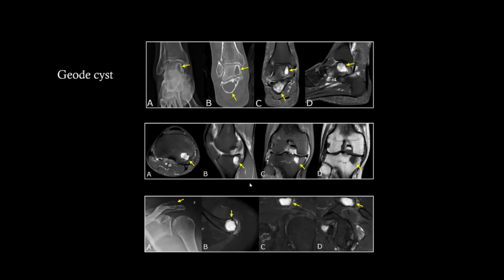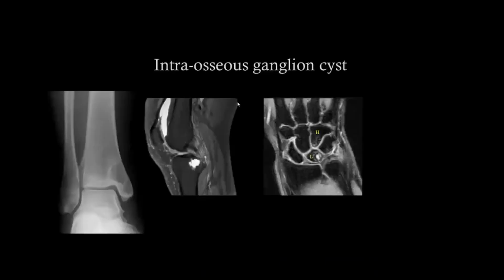Okay. So consider this bone. It is a cyst, so it is fluid in fluid sensitive sequences, and not chondroid matrix like the chondroblastoma or chondroid tumor. Ganglion cyst can present in the carpal bones, and the intraosseous ganglion cyst is a well known lesion in MSK reporting.